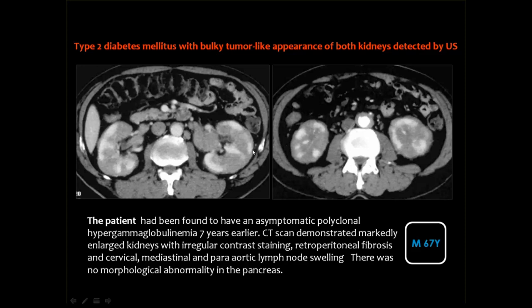They respect the renal contour, they show metabolic activity, but one of the helpful diagnostic criteria of IgG4 related disease is the presence of another disease in the abdomen or elsewhere in the body. And the presence of periaortitis, or this inflammation around the aorta, or if you see the features of autoimmune pancreatitis, this will help you to reach the diagnosis.